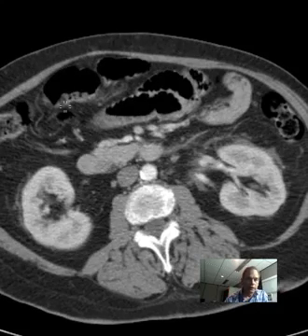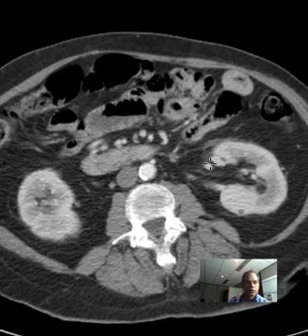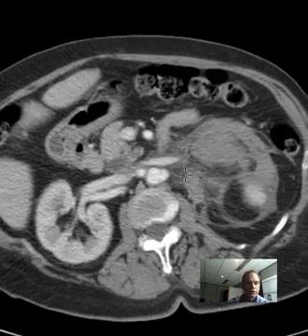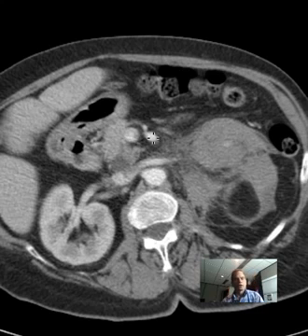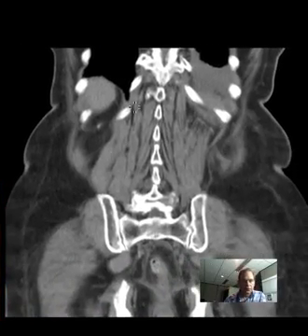So if we go out to the bowel here in the mesentery, and you see all this mess, and you don't know what to make of it because it just looks like all these lines and squiggles and stuff, go back upward to the root of the mesentery. Right here around the pancreatic head, you'll see the superior mesenteric artery and the superior mesenteric vein. Now the superior mesenteric artery is the one that comes out just inferior to the celiac artery.